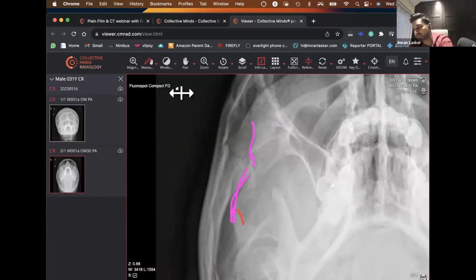So very, very important, if you see that, you've got to look for this one and this one, because then you'd be looking at a tripod fracture. But I don't think we can say that it's a tripod fracture. The maxillary sinus doesn't look like it's particularly opacified. So we're not looking at an orbital floor fracture, where you get a trap door and it just opens up like this, like boop, and then a whole lot of orbital fat comes through it.